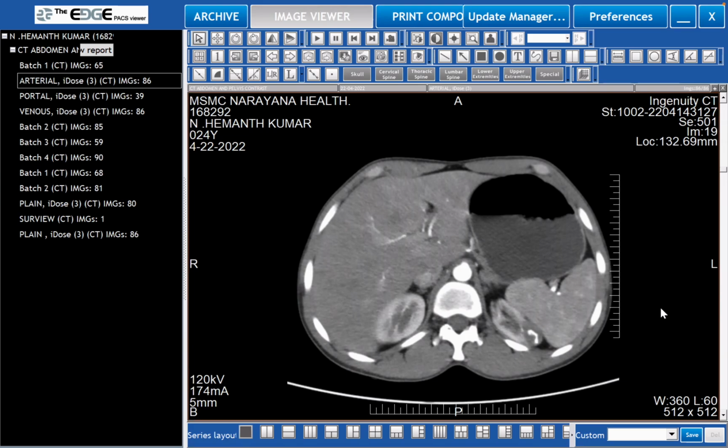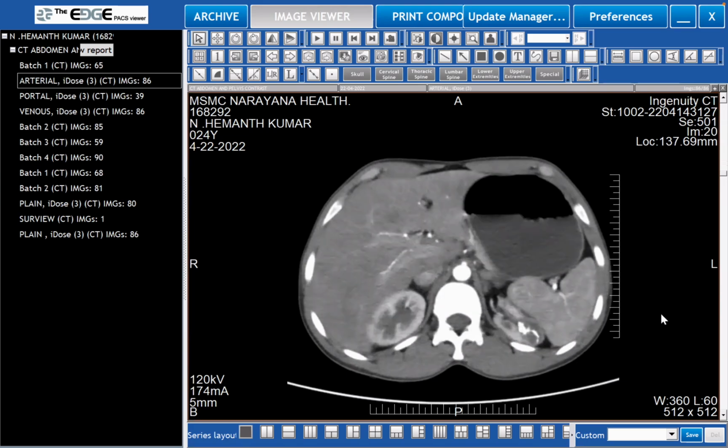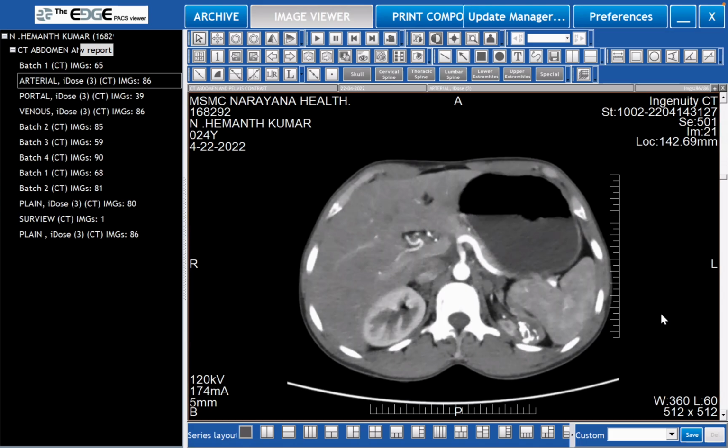Sir, the left kidney is small and contracted. There is a radiodense lesion in the interpolar region of the left kidney with a surrounding hypodense, low attenuated lesion. And apart from this, there are also other hypoattenuated lesions which can be seen near the upper pole of the left kidney. Okay, go to the next frame. Right. Stay there now.